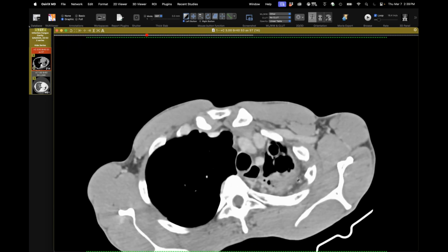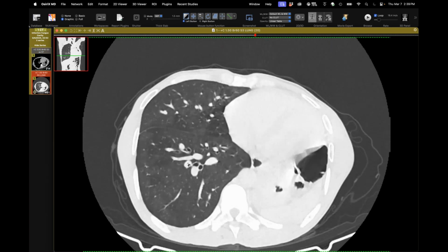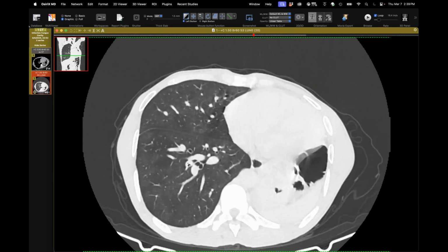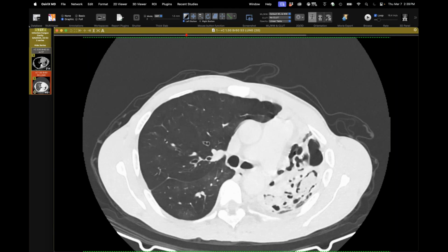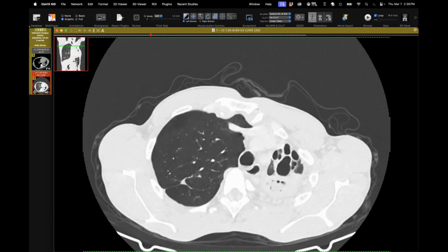So this patient had a bad case of TB, but I don't know if I buy all this old stuff on the right being just from old TB. I guess it's possible they do get bronchiolitis, but this is more like what you see in a so-called Swyer-James, where you get some scarring, some bronchiectasis, and a lot of distal air trapping. Yeah, I agree. That looks more like it. No active TB at this point. It was treated many, many moons ago.